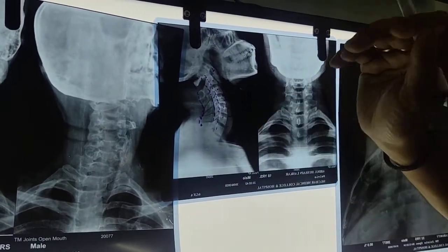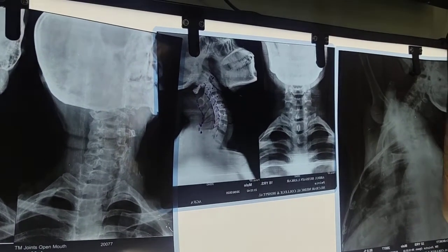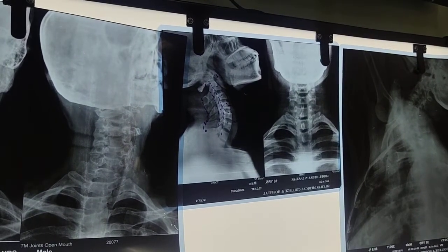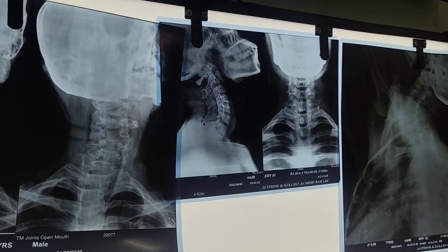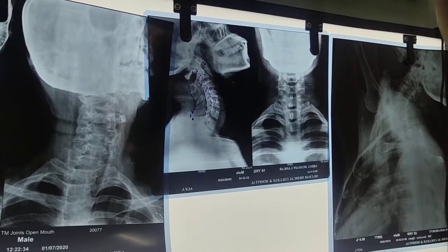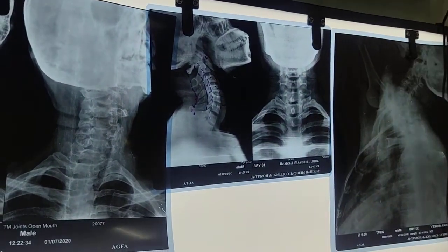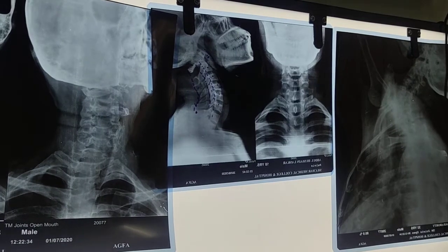Again down below it is more. The soft tissue thickness in the C1, C2 area is high, almost 10, coming down at the C3, C4 level to almost 4, then again almost 17 or 18, and sometimes in an adult up to 22.